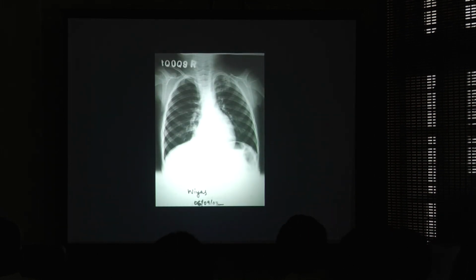Now, finally, we have come to the final stage. I am giving a chest radiograph. Can you just go quickly from A to H and find out what is the abnormality? I'll give you 1 or 2 seconds. Anybody can come up with the diagnosis. Yes? If I give you a clue, just look at B, go for B. B means bone. Just evaluate the bone.